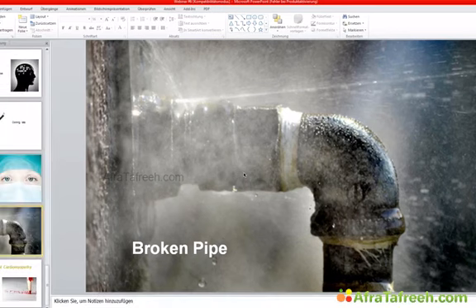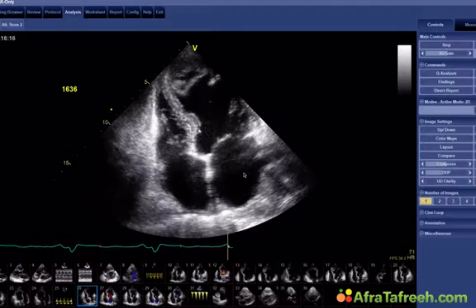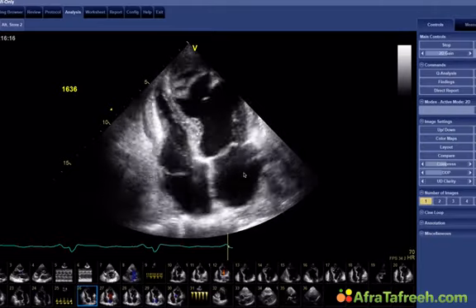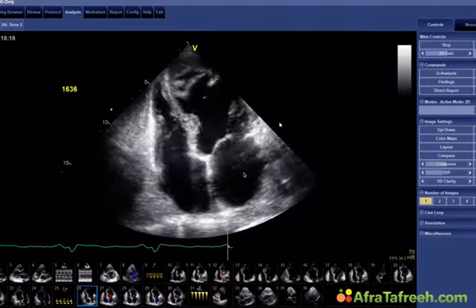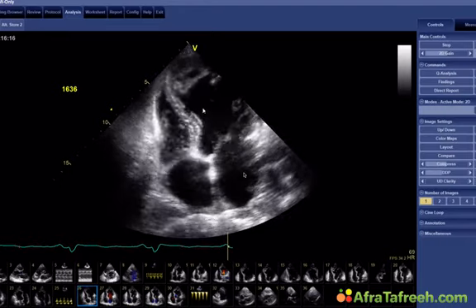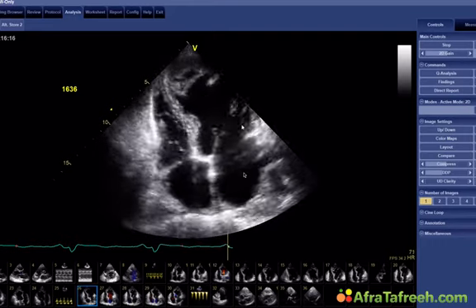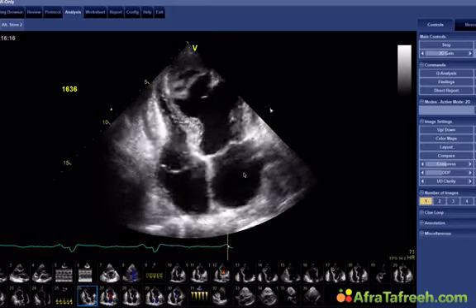Typically, it causes a cardiomyopathy where we have the criteria that I showed you in this patient, where the apex is very dilated, while the basal parts are not as involved, and the ventricle has the shape of a vessel that the Japanese use to catch octopus, which is called Takotsubo.